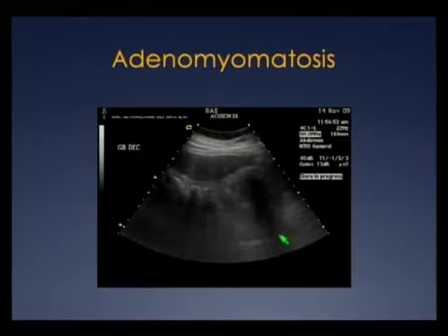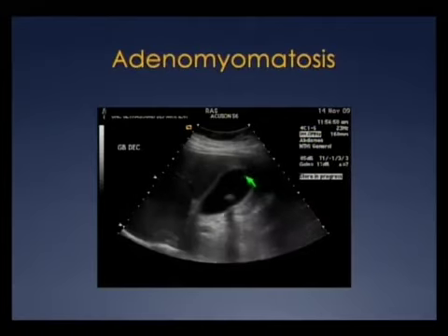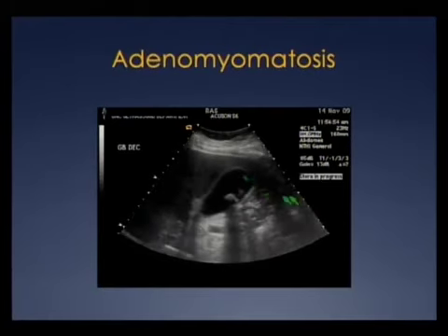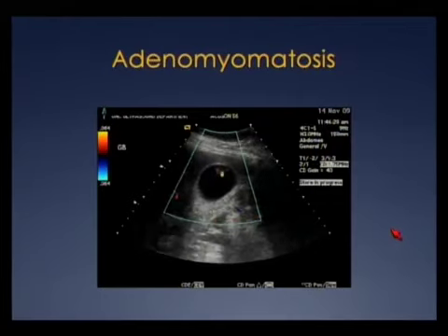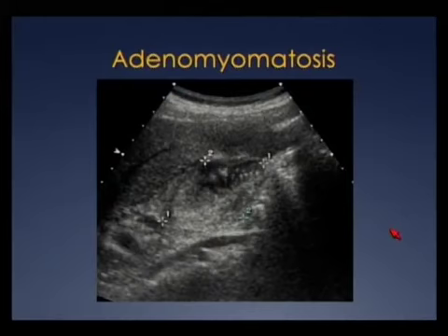So the cine images depict the stones very nicely, in addition to this echogenic focus within the fundus of the gallbladder that has some ring down and some shadowing. And again, we do the color imaging, and we see twinkle artifact, which by Doppler proves not to be arterial or venous. Here's another case of basically gallbladder filled with adenomyomatosis.